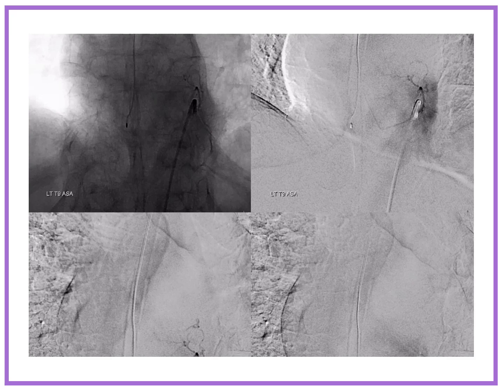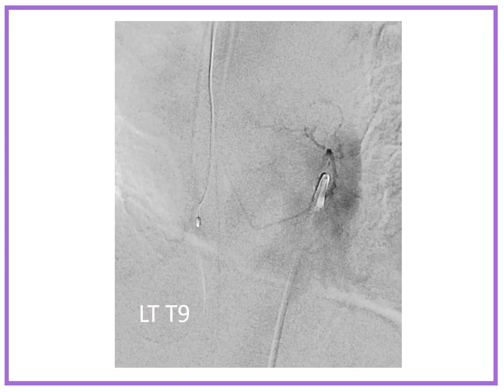This is the left T9. And so we go back and we struggle, and finally we can find this little tiny thing. And that tiny thing shows the anterior spinal artery. It's not labeled here because by now you should be able to recognize that. You can see the hemibody blush in the upper right picture. You see the blush of the left T9 hemivertebral body and the radiculomedullary and the anterior spinal artery that is arising from it. Here we have it in a magnified view. That is the remaining contribution to the anterior spinal axis.